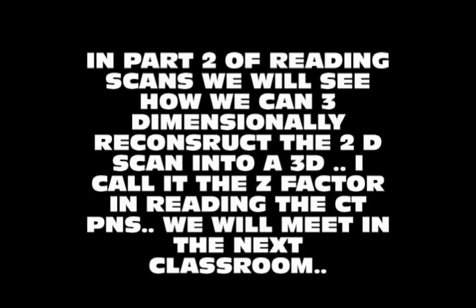Train your eye to read the anatomy, anatomy, and anatomy. In part 2 of reading scans, we will see how we can three-dimensionally reconstruct the 2D scan into a 3D. I call it the Z factor in reading the CT scan, and we will meet in the next classroom.